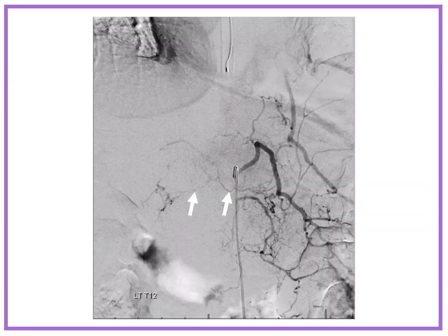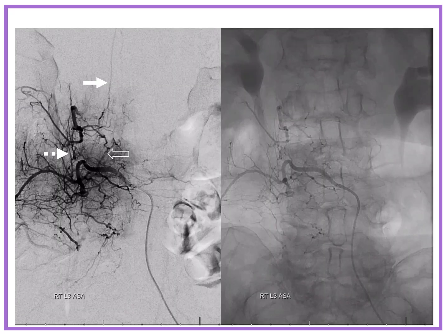Okay, here's left T12. So here we see a typical, again, epidural arcade, the ventral epidural diamond-shaped thing, opacifying the other level. Nothing too great over here.